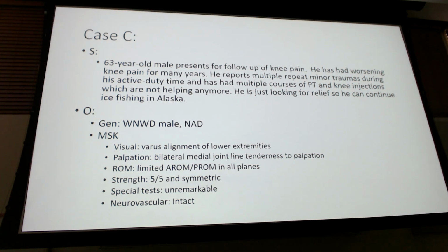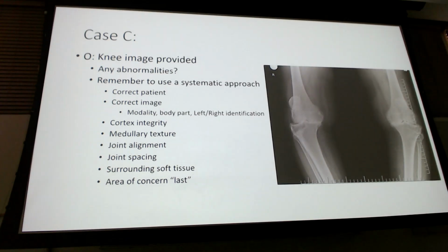This will be a very common order for you guys, especially those of you who are seeing not just active duty, but retirees or dependents. This will be a very common one. And here's your pictures. Take your time.